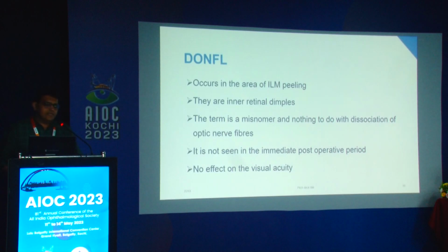So DON-FL occurs in the area of ILM peeling. They are inner retinal dimples. It's a misnomer and has nothing to do with the dissociation of the optic nerve fiber. It is not seen in the immediate postoperative period and does not have any effect on the visual acuity.